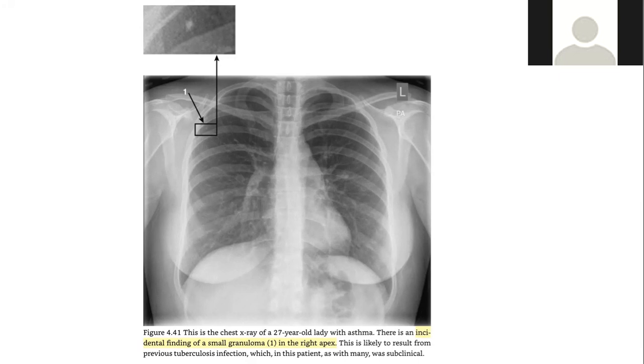That's usually with primary tuberculosis, right? I think so. Yeah, but basically it's really peripheral, and it's like one dot. They form more towards the periphery. I think they were talking about it in the path lab too. If you look at the pictures, they're always very peripheral.